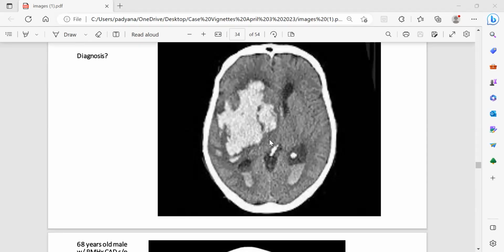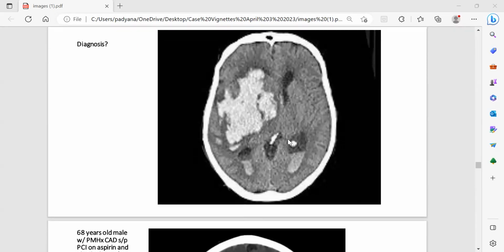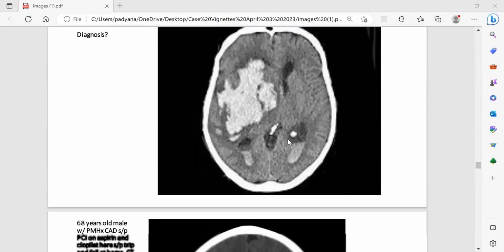And what else has it caused? It has caused midline shift and also a certain amount of early hydrocephalus, and focal edema or diffuse edema, whichever. So when you say all those things, it makes a fulfilling answer, and then the examiner can quickly go ahead to what next.